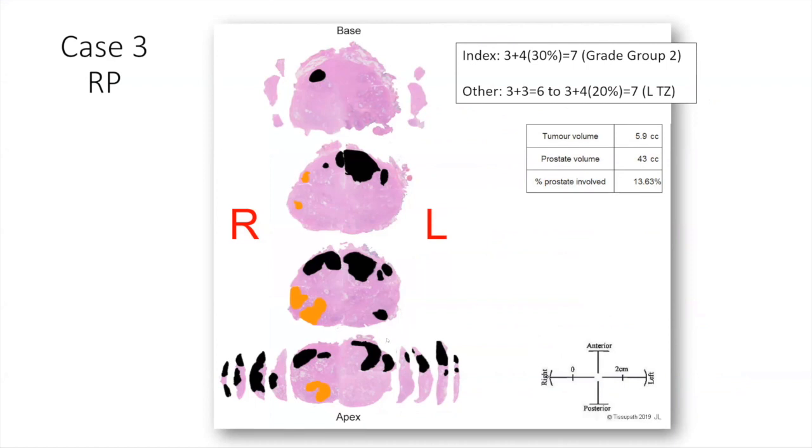On the sagittal, though, it looked as if it was pretty longitudinal. I'll drop the screen and see whether Richard wants to bring it back up. Yeah, let's review that MRI to finish off the session. So you can see that.